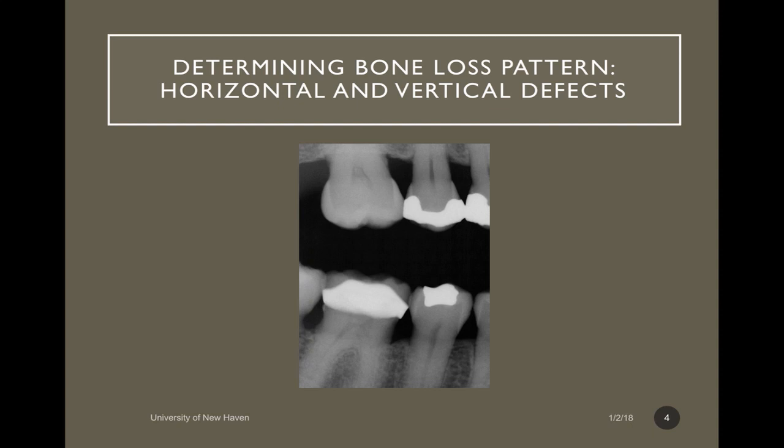If we look at this image here, let's determine if this is going to be horizontal bone loss or vertical.